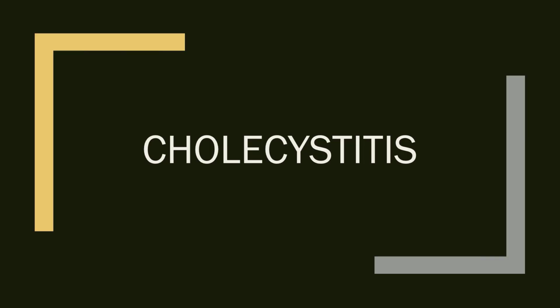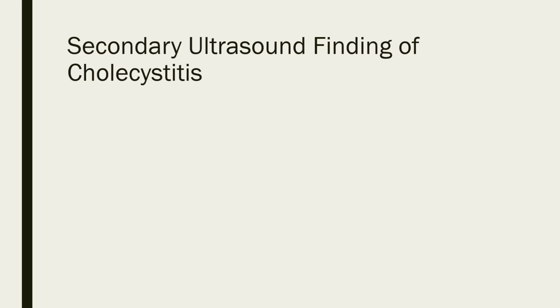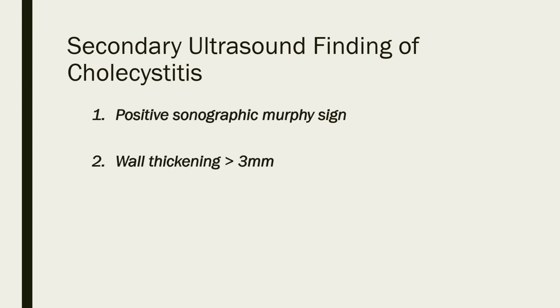Once you have confirmed the presence of stones, there are certain sonographic features that distinguish cholelithiasis from acute cholecystitis. The following sonographic signs support the diagnosis of cholecystitis: positive sonographic Murphy sign, wall thickening over 3 millimeters, and presence of pericholecystic fluid.